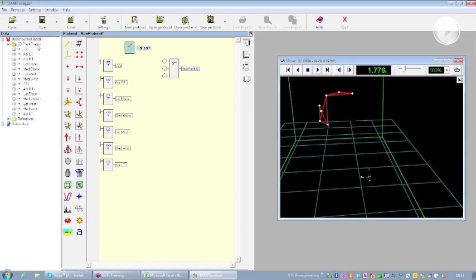I click OK and I have my half point. I want to create a half point between the 2 points of the elbow, so I will select the lateral elbow, the medial elbow, interpolated of course, because we have the chance to use the most complete trial, and the half point. This is going to be medial point elbow, and if I move over the 3D viewer, you can see that here I have my new point.